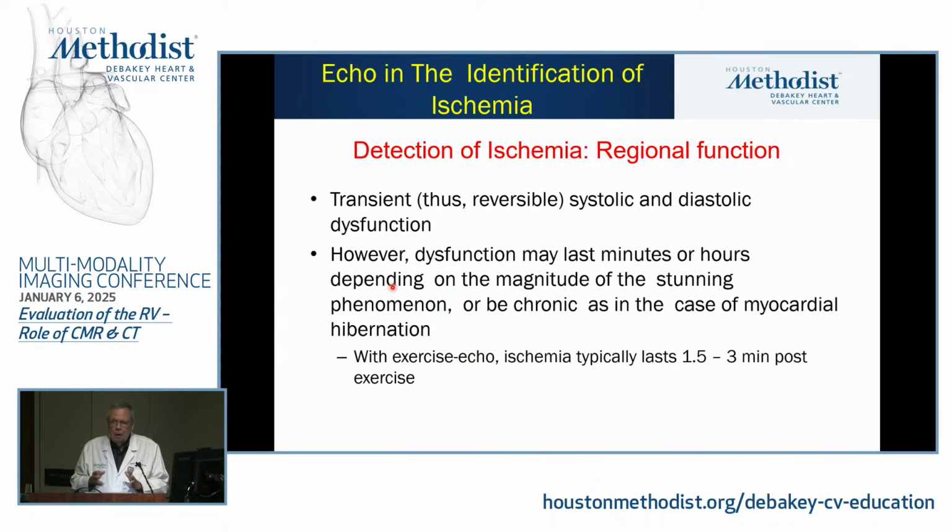So in fact, when we do the treadmill technique, we are depending on that stunning phenomenon to be able to pick it up, as we will see in a minute here. So with exercise echo, particularly using the treadmill, ischemia typically lasts between 1.5 to 3 minutes post-exercise, giving us a little time to catch it once the patient is back lying down.